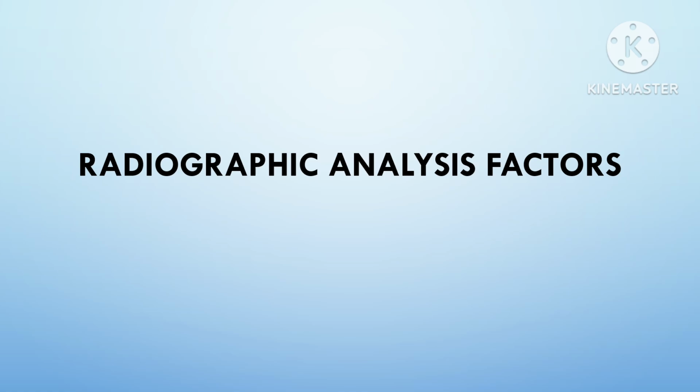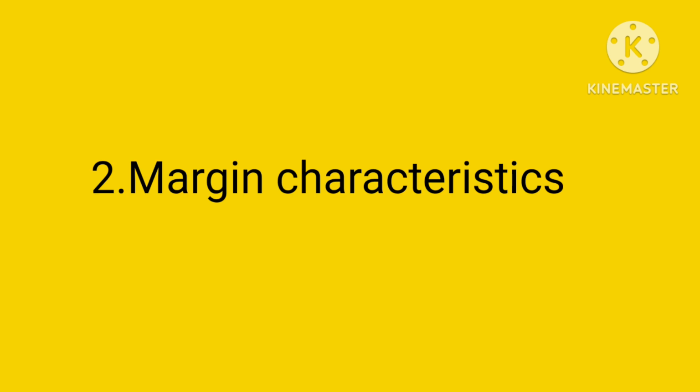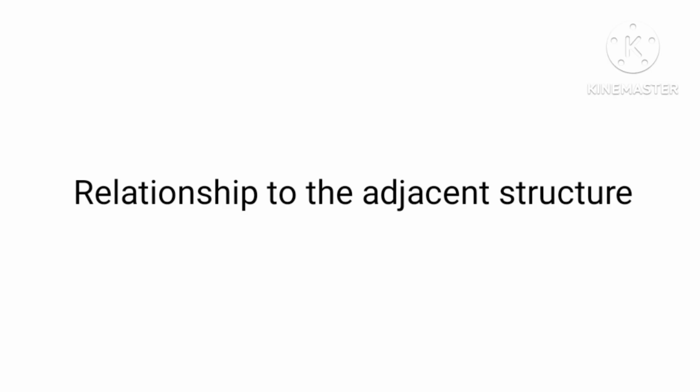When looking at radiopaque jaw lesions, we have to consider several important points, and three important points are the attenuation pattern of the lesion, margin characteristics, and relationship to the adjacent teeth and bone.